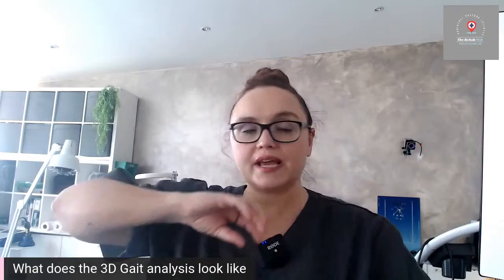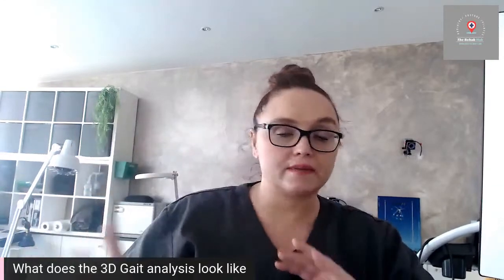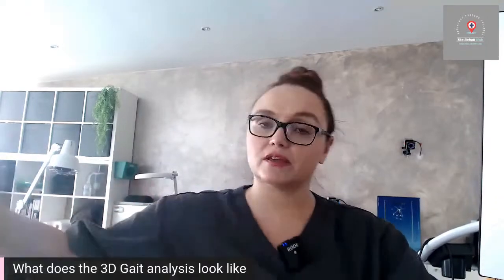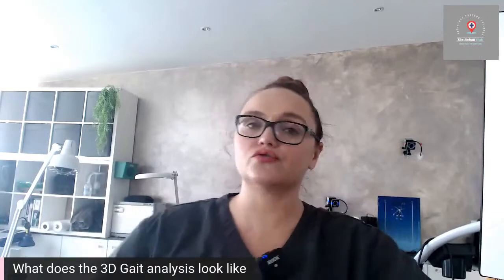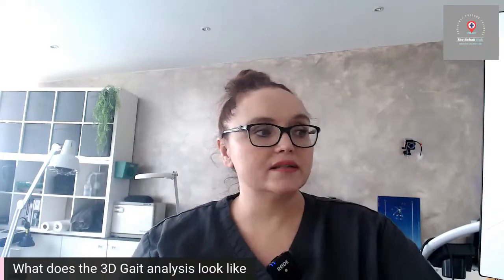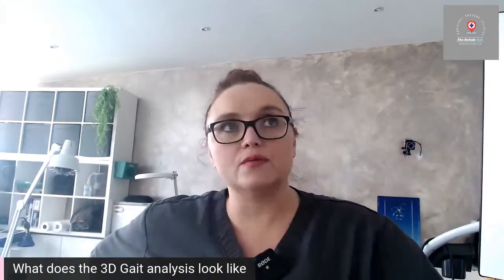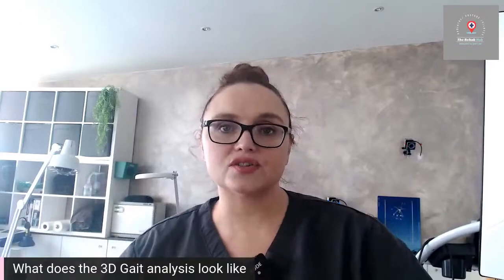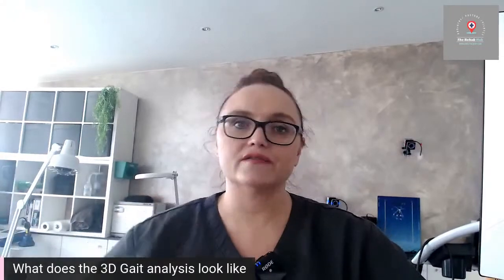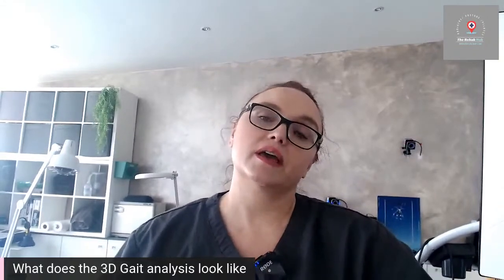From there, we then analyse that even further. You get a full report of your findings that we can help you with in-house, or we can pass that on to, maybe you're working with a physio already, or maybe you've got a coach or a personal trainer. We actually work with great personal trainer Gary Goldie, who works out of the Western Baths. And he'll send a lot of his clients over, and we help. So he'll basically be given: here are the issues, here are the key exercises, here are the key muscle groups, here are the key areas that your client needs to work on. He's then got that information where he can absolutely do the rehab for his clients and get them ready for whatever event or whatever race they're doing.